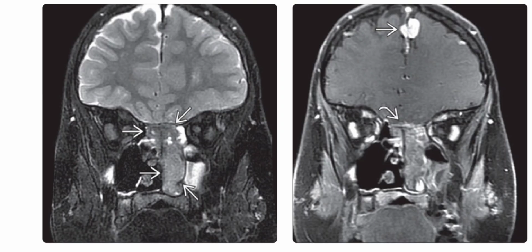Left is the coronal T2 weighted fat-suppressed MRI, and it reveals a T2 hyperintense mass filling the left nasal cavity and extending into the ethmoid air cells. This 19-year-old with basal cell nevus syndrome was radiated for medulloblastoma and developed a radiation-induced rhabdomyosarcoma.